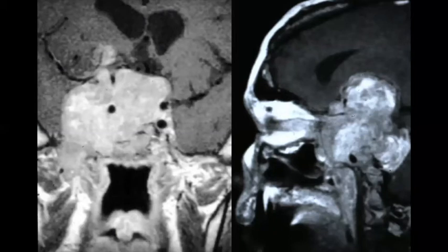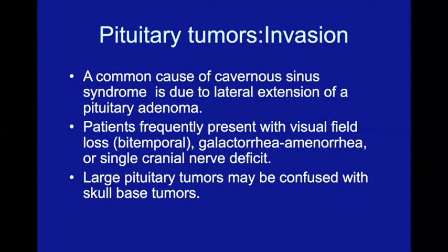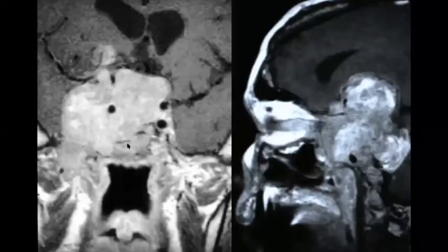So one thing you can look for, and this is what I mean about these giant pituitary tumors, is that you might be inclined to call it some aggressive grade of pituitary tumor, but this histologically is really just another pituitary adenoma. But you see here, there's complete encasement of the carotid artery. When you have complete encasement of the carotid artery, this is the situation where you're going to say this patient has involvement of the cavernous sinus.